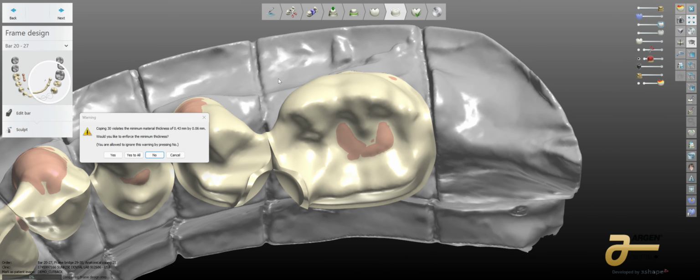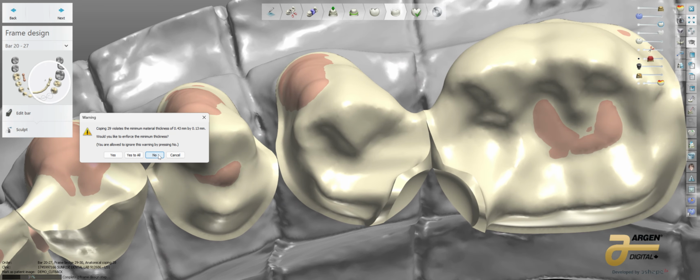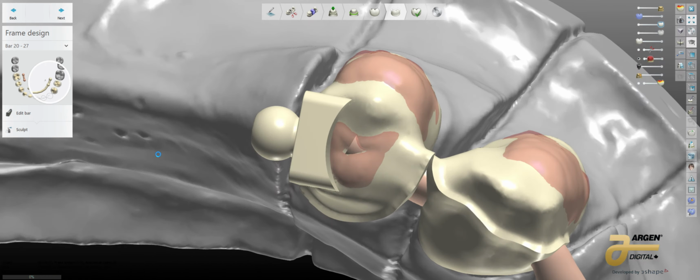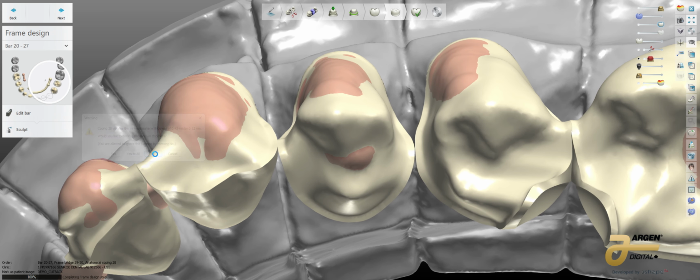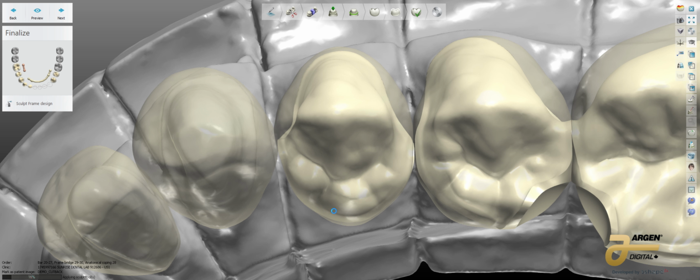Let's go ahead and click through and think about this. Well, the material thickness is thick for metal. I can mill down to 0.25 and still have good results in chrome. So I'm going to say no to all of this stuff. I'm not even going to think about it. I'm just going through the whole thing and going to town on this. And once we get to the final stage here where it can combine and it's going to allow me to sculpt, I try to do very minimal sculpting over here.